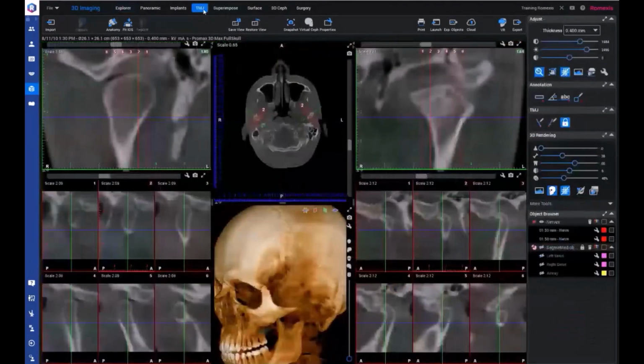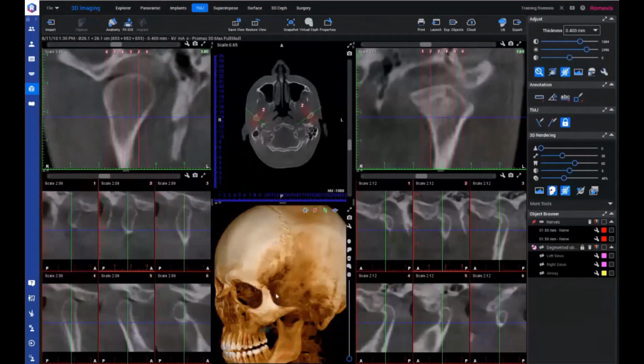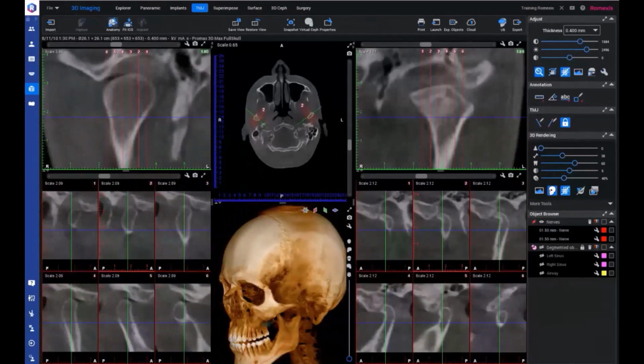Now with the help of AI, whatever we have captured, the CBCT, if you have configured so that Romexis automatically runs this smart anatomy, it will also detect landmarks from the volume. And the landmarks are cephalometric landmarks that it finds there. And thanks to that, Romexis will also automatically be able to give us all these views directly when we open up the TMJ module for the first time for this patient, for this image.